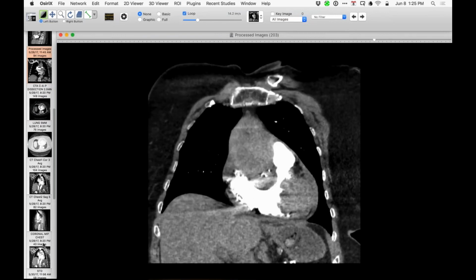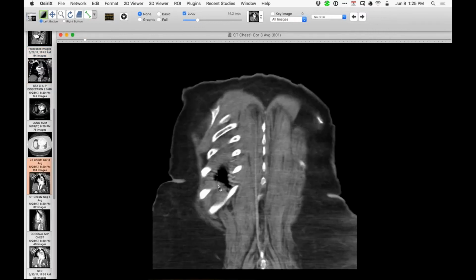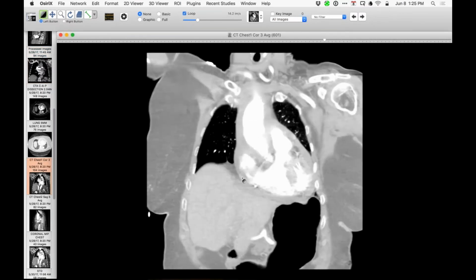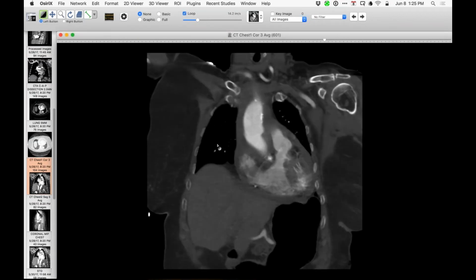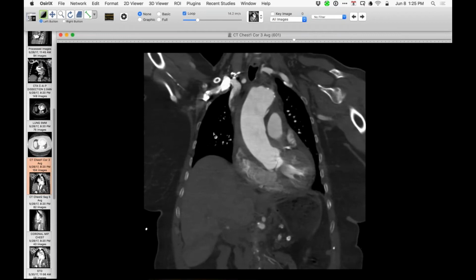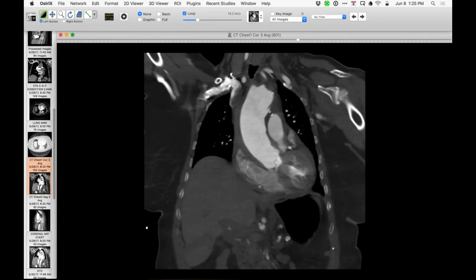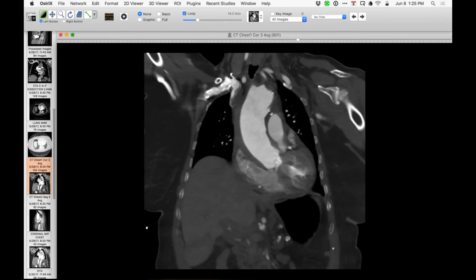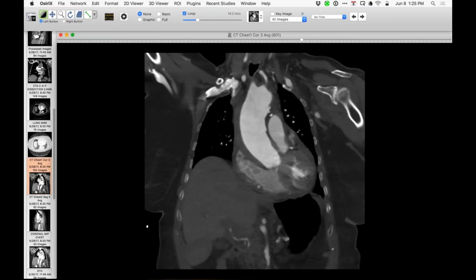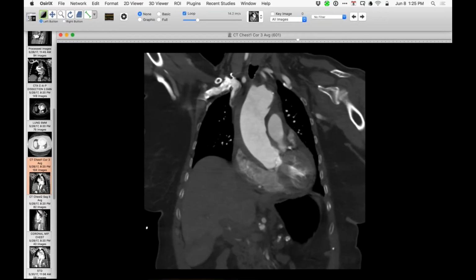the appearance of the aorta on the outside exam. So we've got an IMH, and take a look at this here. Sorry to prolong this, but it's really interesting. I was really intrigued by this intimal irregularity there, and wondered whether there was pathology or a potential breach of intima there. Hard to describe, but there's definitely an intimal layer abnormality there, and whether that could be a source of emboli.